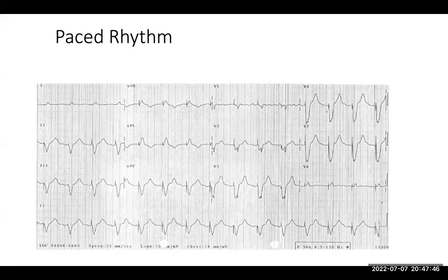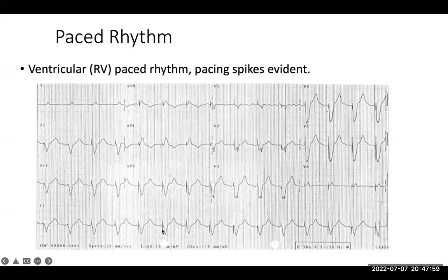Finally, in the era of devices, a lot of patients have got pacemakers. You may even be told to examine a patient with a pacemaker. You touch the patient's chest. Usually it's in the left lateral region, and always look for this. This is called a spike, where my arrow is. And that brings us to the end of the session.